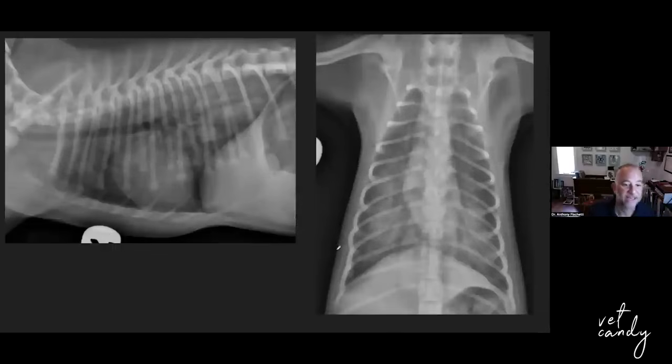Oh man, I can give you a history for this radiology flashcard. I know he's young because he doesn't have mineralization of the cartilaginous part of his ribs. I know he's young because he does have physes here. This guy's just like 7 or 8 months old, okay? And he's got this fulminant caudodorsal lung pattern. See how white the lung pattern is out at the periphery?